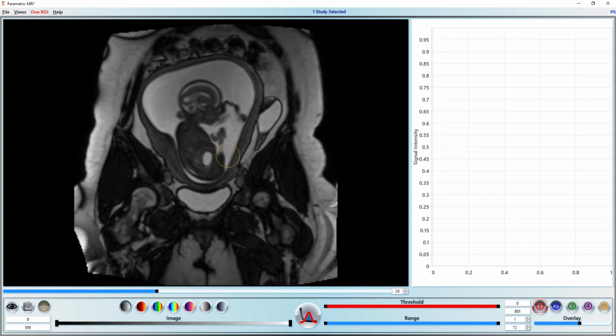Let's look at more ways to manipulate ROIs. As we saw already, we can define multiple ROIs by using the ROI toggle buttons. We can also toggle the visibility on and off for individual ROIs by clicking repeatedly on their ROI toggle buttons. The overlay slider adjusts the overall opacity of the ROIs. The ROI menu at the top allows us to perform some operations on the regions.